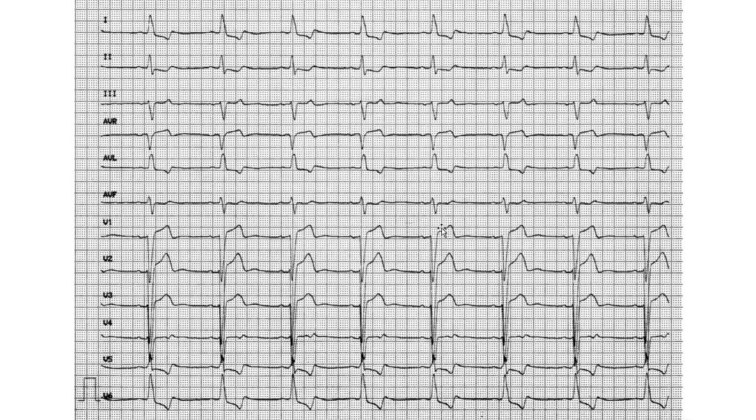So if we check over here, this was the example I wanted to see. This is clearly a T wave, but I'm not sure what's going on here. Is this a small T wave, or is this a biphasic T? How do you tell? Well, there are T waves over here, and from the beginning of this square to the end of this square is all T wave territory. We can go down, and clearly in this part there's some of the T wave here and some part increased here, and same thing here. So it's down here, but then it's up here.